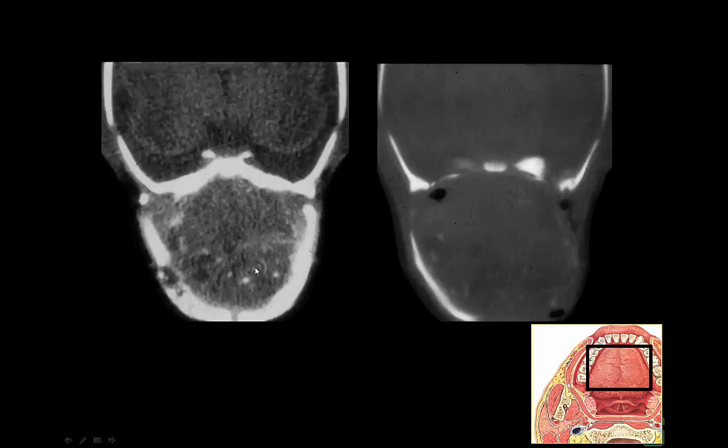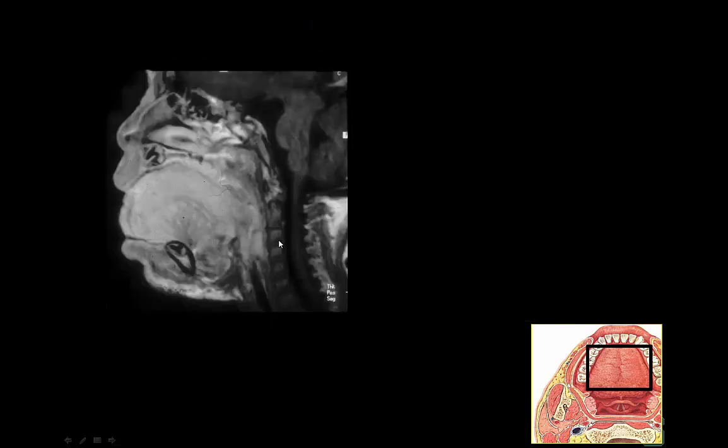This was another kid that had a teratoma. One thing I've learned over time is that radiologically, at least for me, when you start seeing these punctate calcifications, it's difficult to differentiate between a benign and a malignant teratoma. These calcifications don't look too bad. I think they're not really the aggressive type, but this was actually an immature, malignant teratoma. So from my standpoint, if I can make the diagnosis of teratoma, that's great. I'll let the pathologist determine whether it's benign or malignant, i.e. mature or immature. I think radiologically it's very difficult to do.